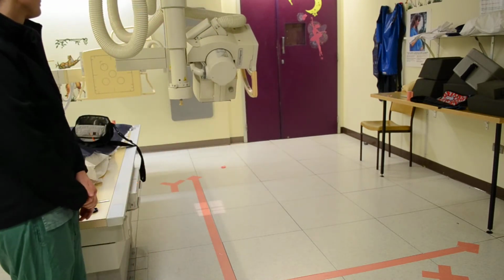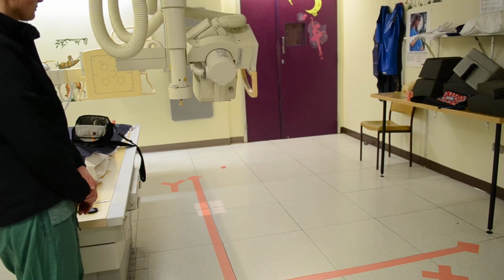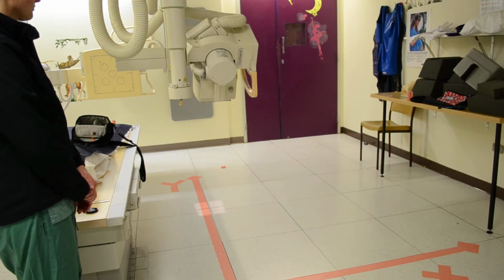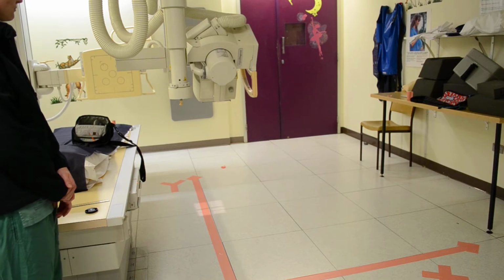Okay, so at this point we've arrived here. We've turned the tube through 90 degrees and it's rotated around the Z-axis, which in this case is a vertical column. And the angle of the beam along the X-axis is now 0. Effectively, the beam is vertical in relation to the X-axis. But if you look at what's happened in the Y-axis, the 30 degrees that we had along the X-axis is now 30 degrees along the Y-axis.